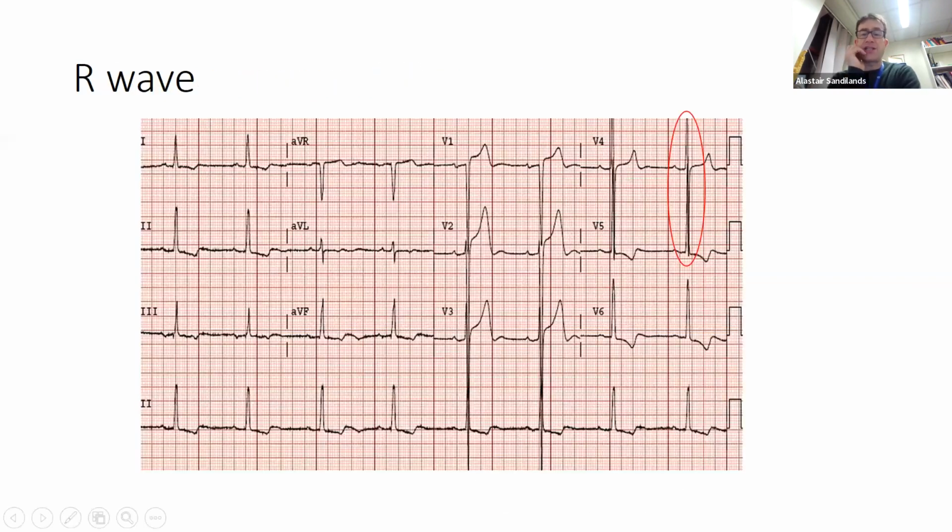Okay, so when you're looking at ECGs, you go through your basic algorithm. In this example, you're probably going to end up saying, yes, the QRS is narrow, but you can see the QRS is sort of bridging other areas of the ECG. So certainly a tall R wave, a very deep S wave here. And so the calculation of this is like 35, 38 millimeters down, plus 30, 33. So you're looking at something like over 70 millimeters height of the V1 S wave added to the V5 R wave, and that's clearly left ventricular hypertrophy.